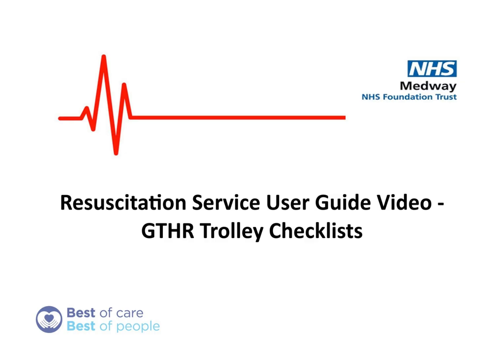This video will demonstrate how to access the Gather system using the sheets that you will find attached to your cardiac arrest trolley, how to document when checks have been completed, and finally, we will look at the Gather system itself to demonstrate how to complete the checklist.